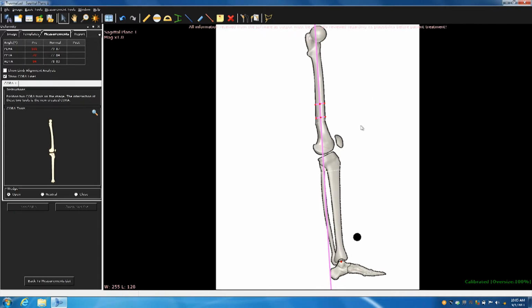You can, and this is the other aspect, that you can draw this midline. You see that it's not intersecting at the 1/3, so you know there's a deformity distally. Then you can say, okay, if I drew this line, extend it proximally, it looks pretty good. And if you look at the bow proximally, there's not a significant deformity. Then it might be rotation or something else, but in this analysis, it's okay and you can get away with it. But sometimes it can fool you with some of the crazy cases that we've shown.